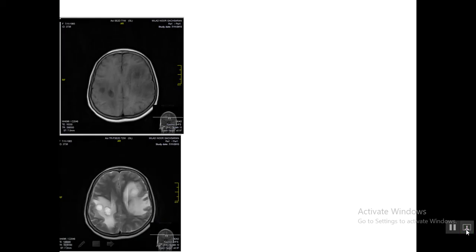Generally, when we encounter disproportionate edema around an MR brain lesion or more than one MR brain lesion, we should be highly suspicious about brain metastasis. And here, in the background of edema, we could not find a primary focus of the metastasis.